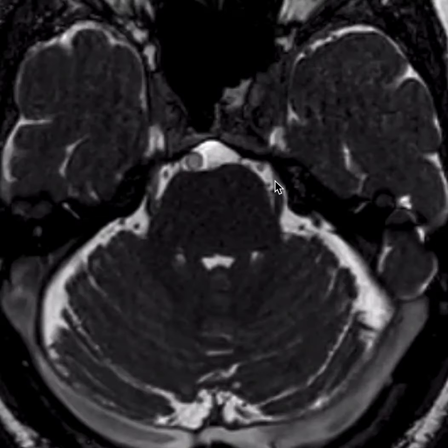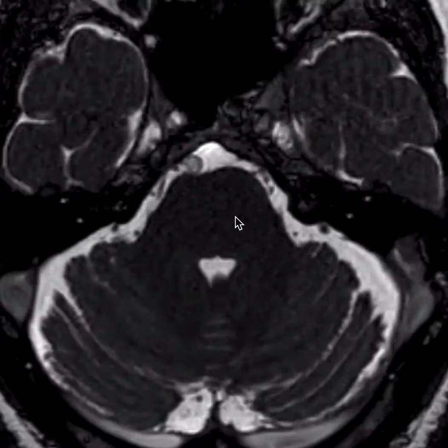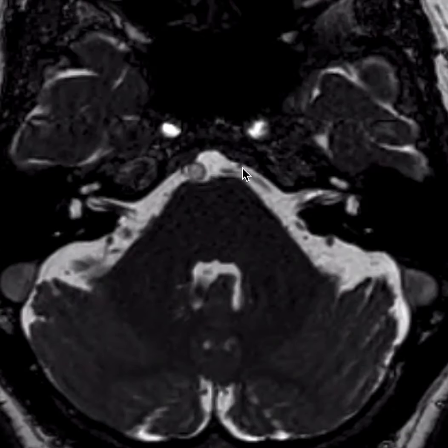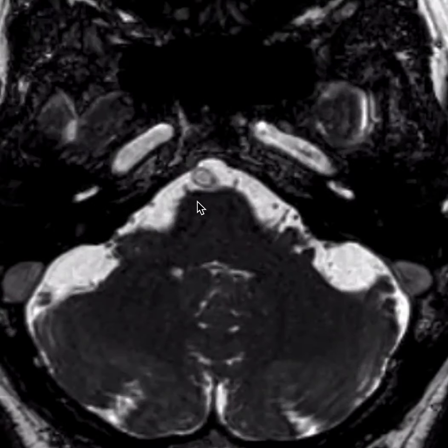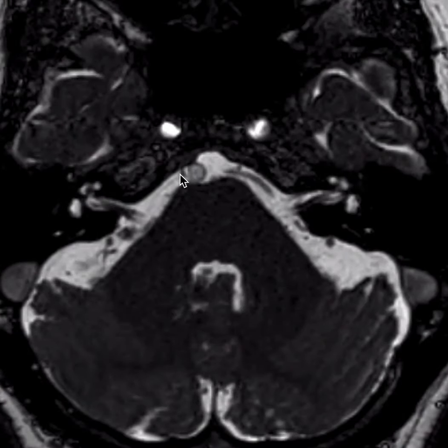As I continue to scroll inferiorly and watch the basilar artery, we'll see it give rise to an important vascular structure right here. This is the anterior inferior cerebellar artery, which is going to course posterolaterally back here, next to the porus acousticus back here. Cranial nerve 6, the abducens nerve, can also be seen down here, coming off the inferior pons. The abducens nerves are going to course anteriorly through the prepontine cisterns and enter the Dorello canals here and here.